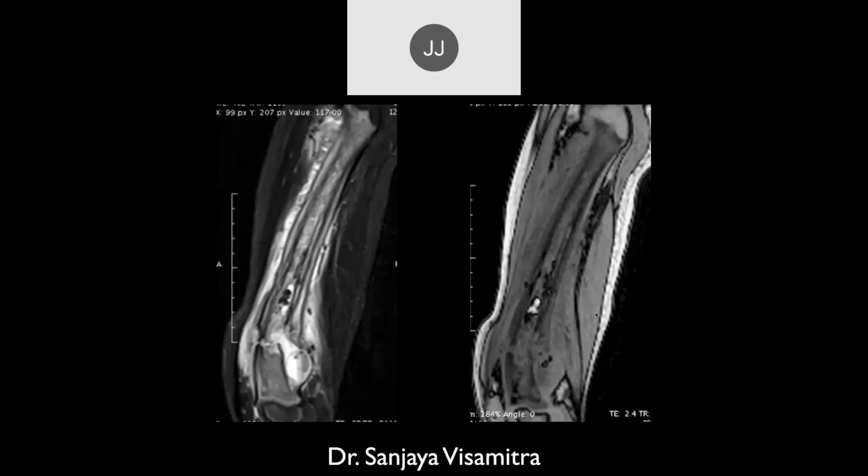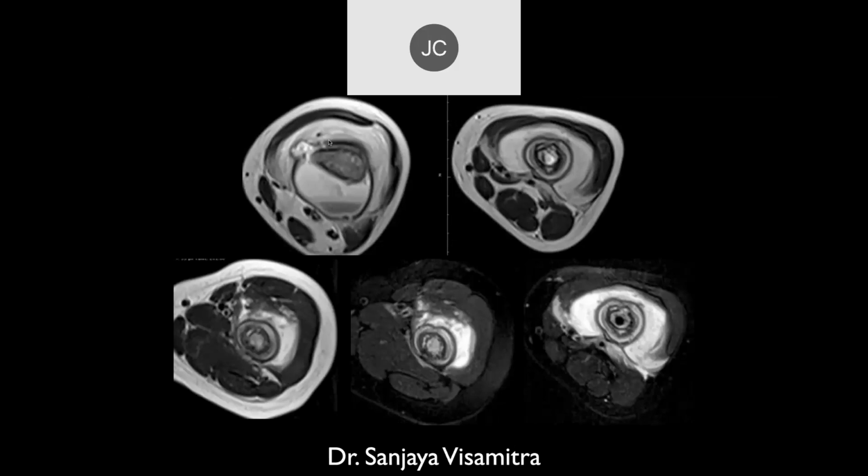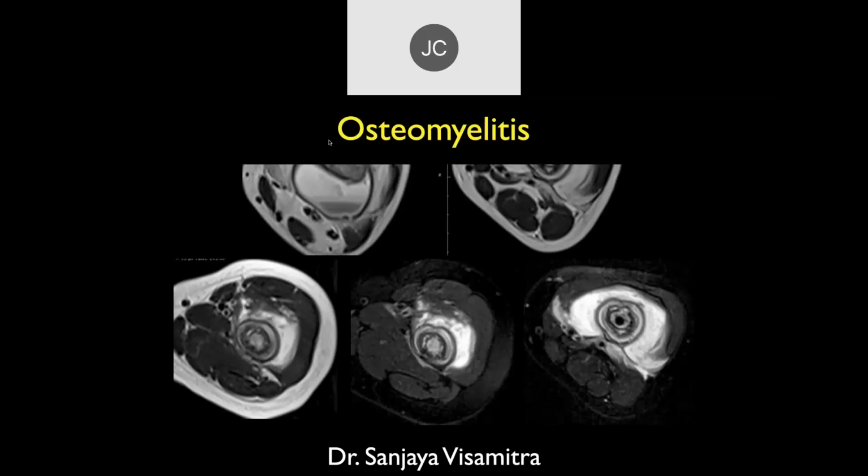Okay. It shows this massive periosteal reaction, fluid. So this is chronic osteomyelitis with an abscess and fluid collection.